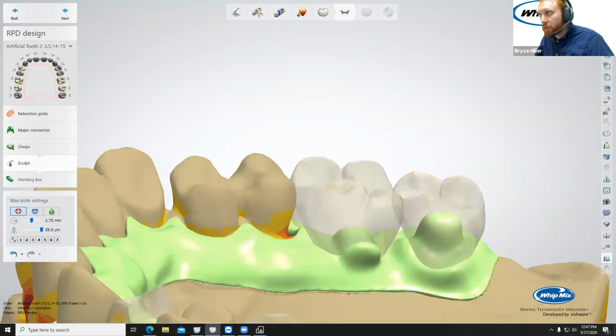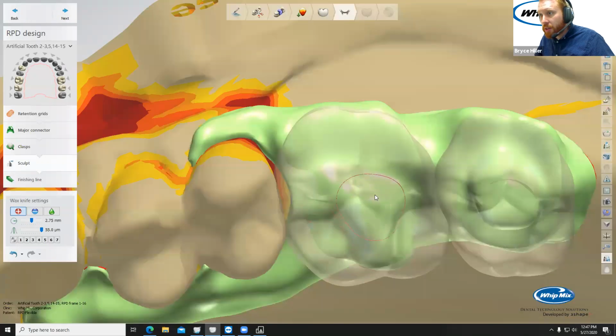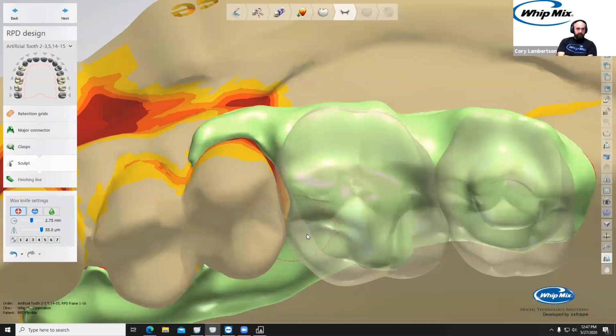The other thing you want to make sure you do is fill in all the way underneath. It's okay if you overbuild it. That's not a big deal because we're going to cut the pockets. Yep. So definitely feel free to overfill it.